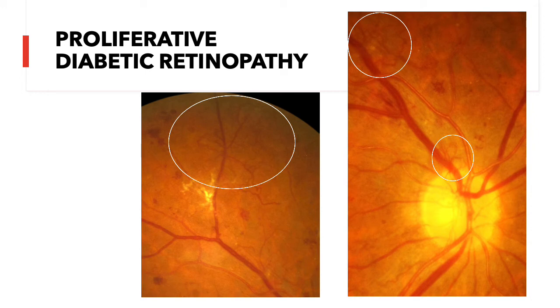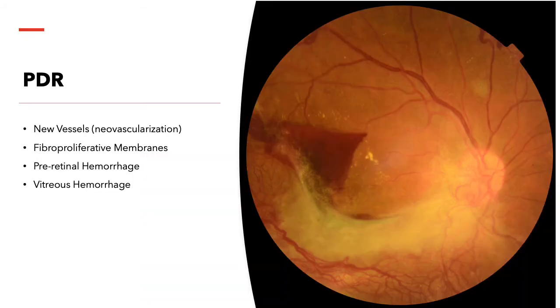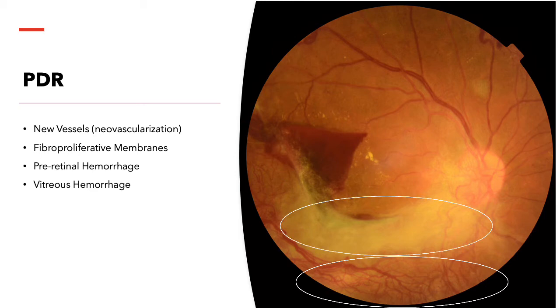So it is important, when you examine fundus photos, that you check for these blood vessels, because these new blood vessels are what you call the heralds of the stage of proliferation. Over time, without the benefit of laser treatment and proper blood sugar management, the new vessels grow wild. They can spread across the retina, and as I said, they can grow into the vitreous, and they actually form fibrin membranes with them as they grow.